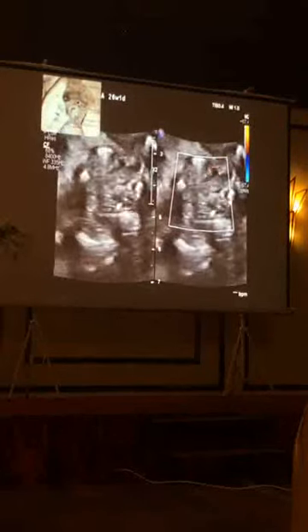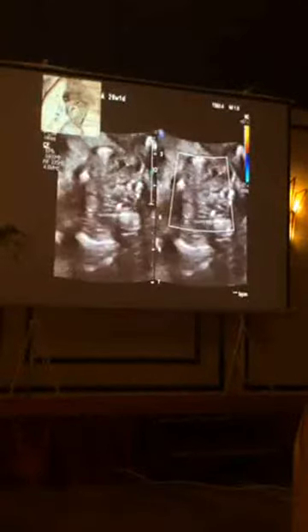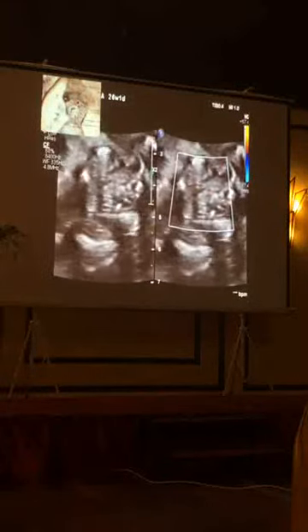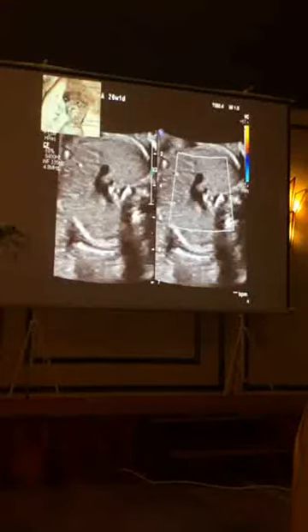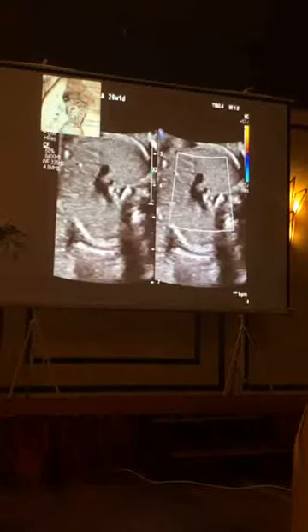You just have to know what you are looking at, because as a matter of fact, it's useful, and I showed you before that in this kind of image, we can see the origin of the right subclavian artery that sometimes is showing here. So when you want to diagnose the aberrant right subclavian artery and you are not sure if you can see something like this, certainly this is a normal subclavian artery.